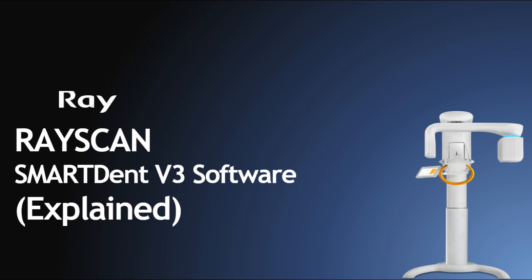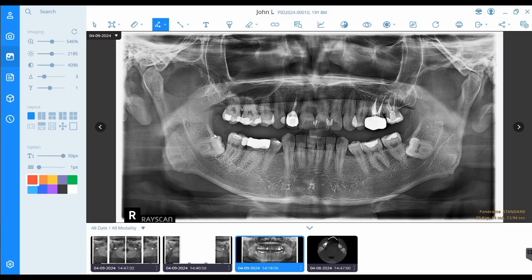SmartDent tutorial video. In this video, I will demonstrate when you take a panoramic image, you're able to view that image in the SmartDent software. This is the software that comes with your X-ray machine.